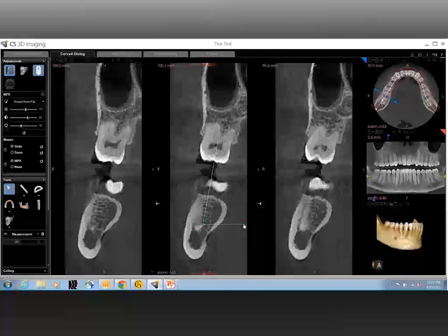Now, how does it help you in terms of implant evaluation? In cases where loading of the implant becomes critical, especially in the posterior area, it is good to identify that angulation of the ridge to change any kind of angulation that is needed in the surgical procedure.